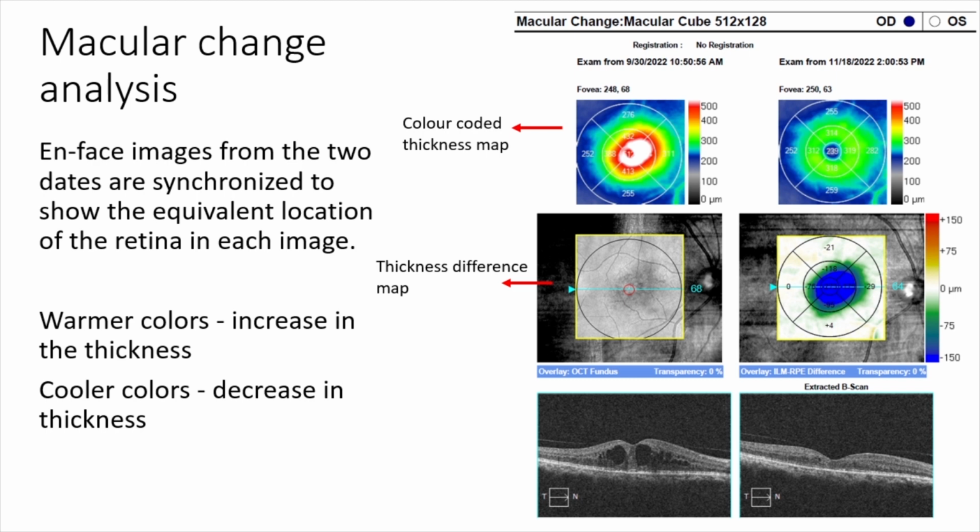So if the patient is coming for the next time, the machine can give us the values in a color coded map. Qualitatively we can see that the edema is reduced. Also, the warmer colors have turned into green. Here again, the subtracted numbers are given over here, the difference between the two thicknesses. So this also can be seen.